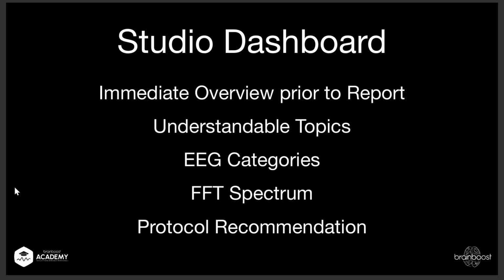Now, what is the dashboard about? The dashboard is supposed to give an immediate overview prior to a report. Before, you had to do an EEG recording and then create a report, to see how the theta beta ratio and high beta beta ratio are, to get an idea how the EEG data looks when interpreting it. With the dashboard, before you even create a report, you should already have an idea how the client's EEG can be interpreted. It makes sense once I share my BrainAssistant with some examples.